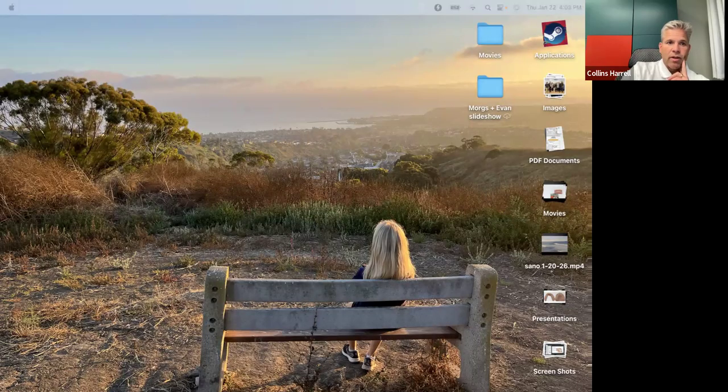Let me move some stuff out of the way here. What should I show you? Let me do this.